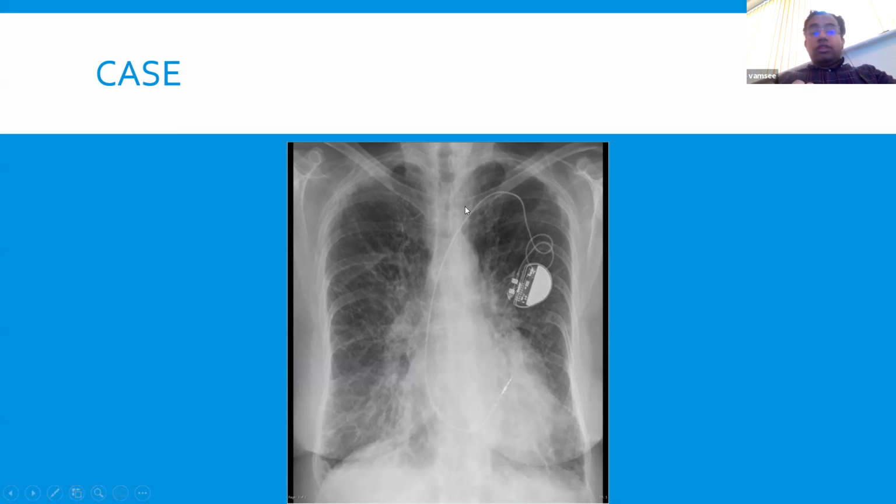Now, the things that are giving this away here are, one, you've got your pacemaker here, suggesting that this gentleman has a single lead pacemaker, with, I would say cardiomegaly, but it's hard to comment because it's just so much, but I would say it is quite likely that this is cardiomegaly there, definitely. You've got a lot of interstitial lines here. You've got some upper lobe diversion, probably most prominently seen on the left, but also present on the right. You've again got this bat-wing appearance of interstitial pulmonary edema, most prominently in the lower zones rather than on the upper zones here.